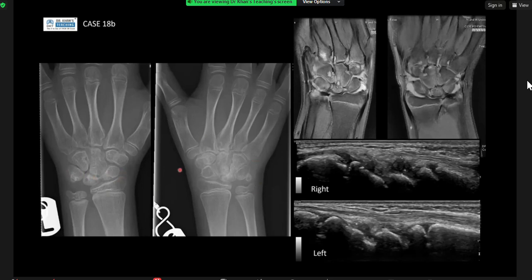On the left and on the right, you can see there is a widening of the scapholunate. You've got the subluxation of the capitate, all looking a lot like what you think in rheumatoid arthritis if it was in an adult. Similarly, the changes on MR show the bilateral joint effusion. All these little cystic-like appearances could be subchondral cysts, could represent erosions more than subchondral cysts. Probably erosion given the extent of disease.